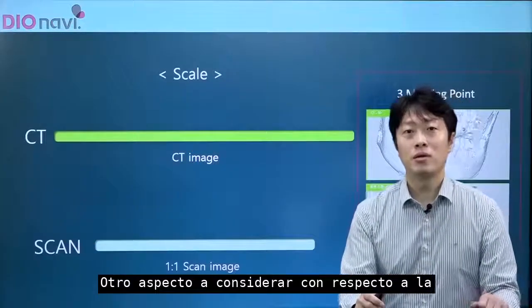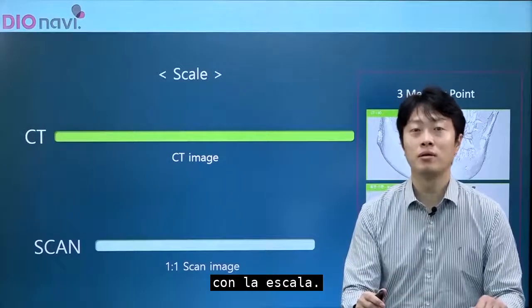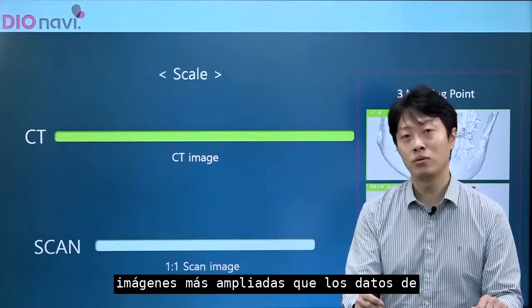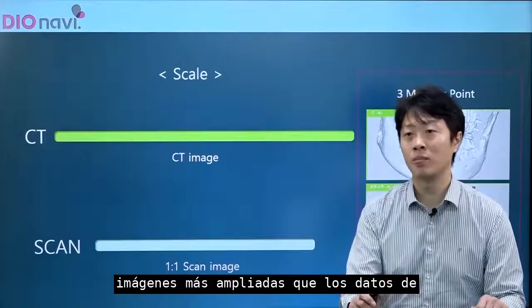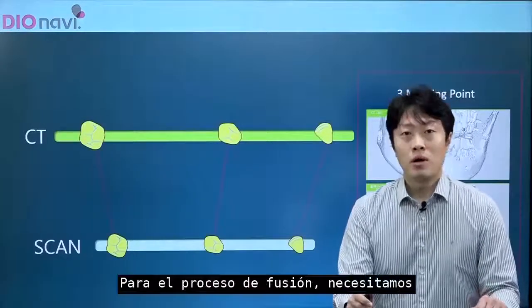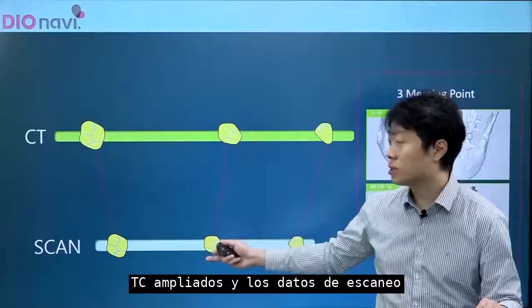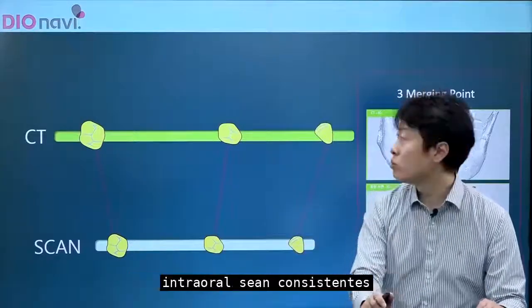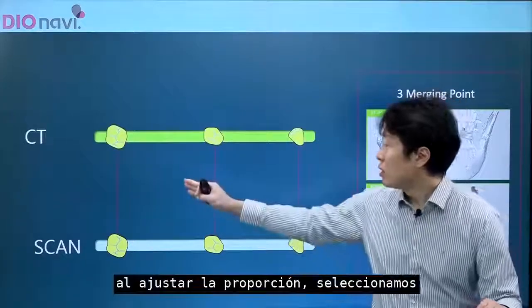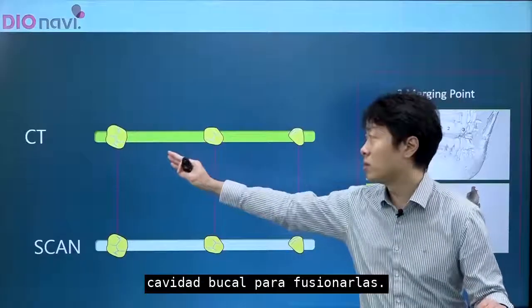Another aspect to consider regarding the CT data acquisition is related to scale. The CT data generally has more magnified images than actual intraoral scan data. For the merging process, we need to adjust the ratio so that the magnified CT data and the intraoral scan data are consistent. When adjusting the ratio, we select 3 tooth locations inside the oral cavity for merging.